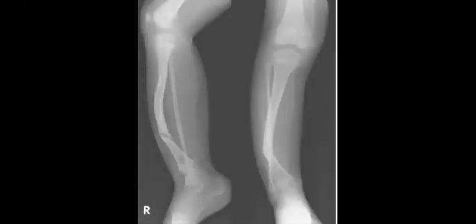Okay, the other differentials will be less likely. Yes, osteogenesis imperfecta, rickets, Paget, not at this age, and maybe Blount disease. What else? Idiopathic. Yeah, achondroplasia, maybe, but achondroplasia will be shortening of the long bones, not like here, so it is a bit different. Okay.